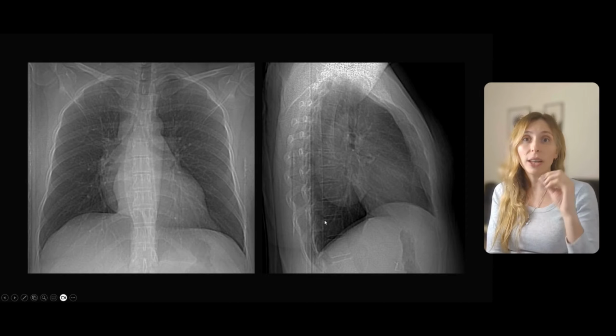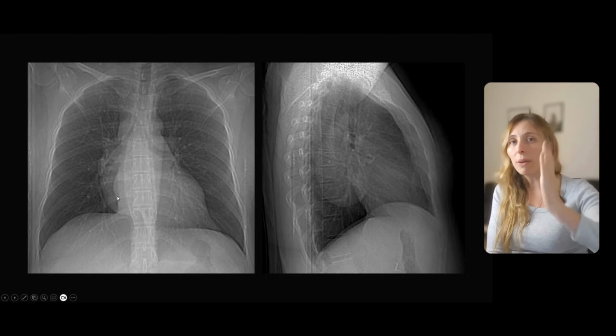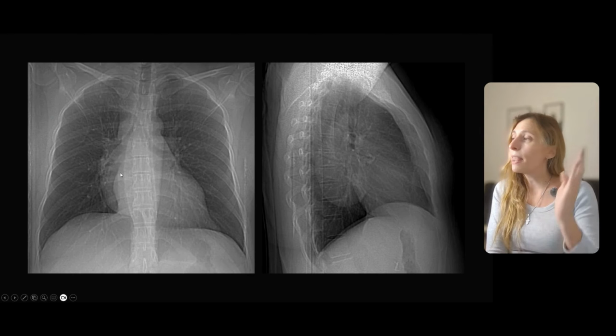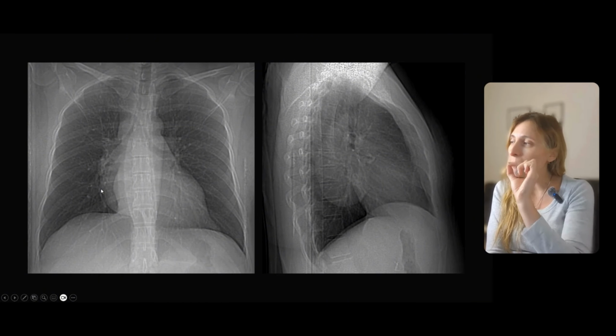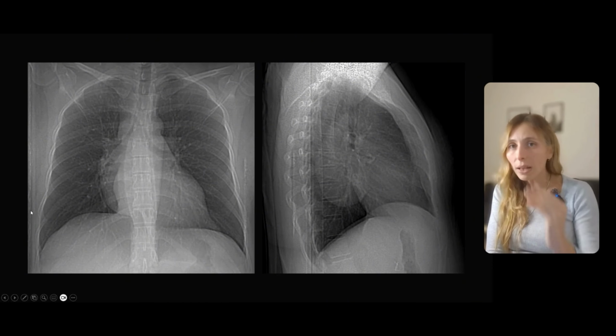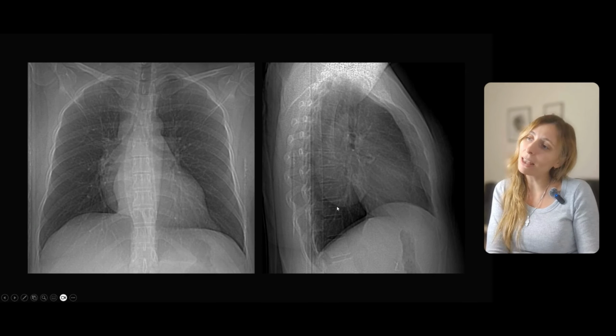You can see here on her chest X-ray, we have a PA view and a lateral view, and here we can see a double line. I don't know if you can see here we have a line, and here we have the other line. This one is the normal right border of the mediastinum. Here we can see the right wall of the right atrium, but this line should not be here. This is pathological, and you can see that we can define the borders perfectly. These are well-defined, sharp borders, and in the lateral view, we can see the same finding.